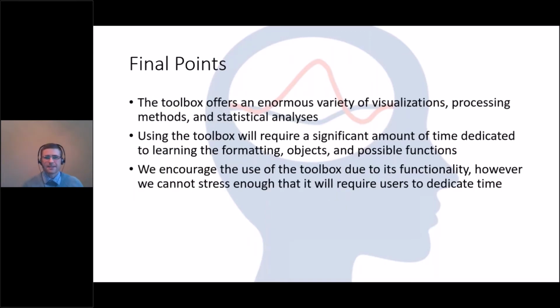So this is the kind of general run through of the toolbox. I hope it can get everyone off and running on it. There is definitely a lot more that you can do with it than what we covered today, but this should at least give you the opportunity and the understanding of where to look, how to call things, what kind of formatting it does, and get you off and running.